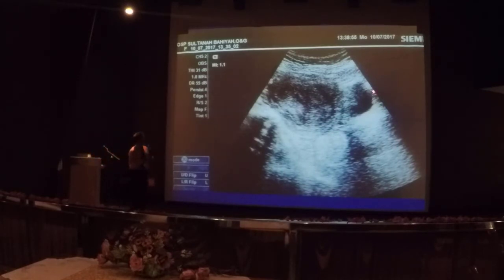This is another one. You've got a bladder here, okay? So then you can see the well circumscribed, mixed echogenicity, hypoechoic, some part hyperechoic lesion within the myometrium, which is typical of leiomyoma. But all the images are not very good, right?